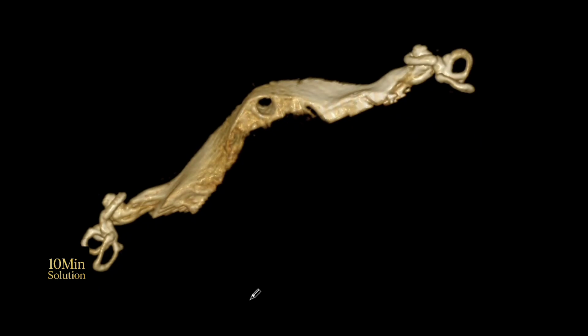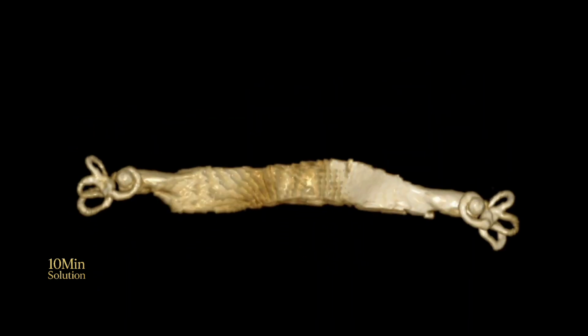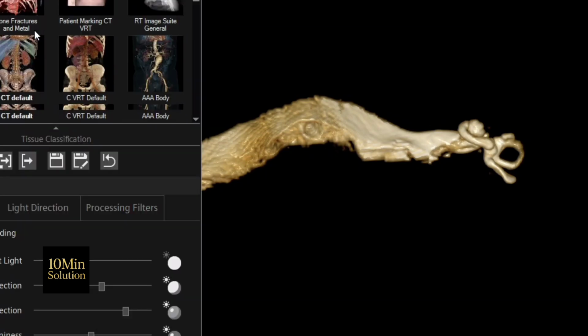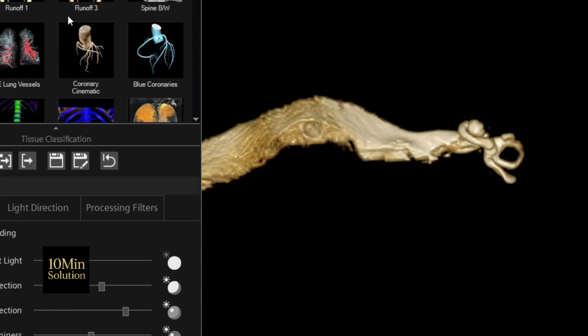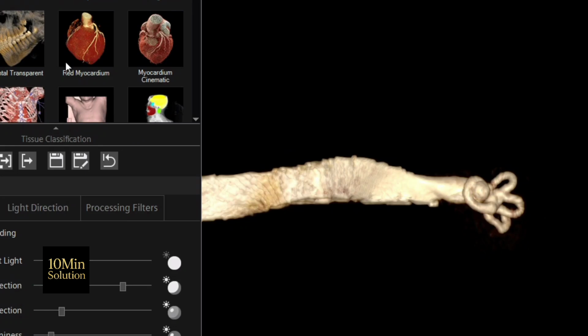Measurement and analysis. Measurement is an important part of post-processing. Cochlear size and morphology are evaluated. The integrity of the nerve is assessed. Comparison between both sides is performed. These analyses support accurate diagnoses.